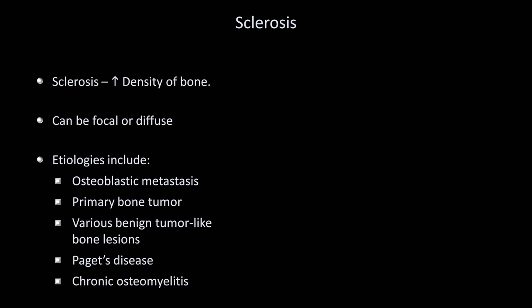and chronic osteomyelitis. As a hospitalist, I feel pretty comfortable interpreting chest x-rays, but sclerotic bone lesions are one time when I always consult a radiologist, because differentiating the various possible etiologies based on radiographic appearance is a very subtle art and requires the experience only a radiologist is likely to have.